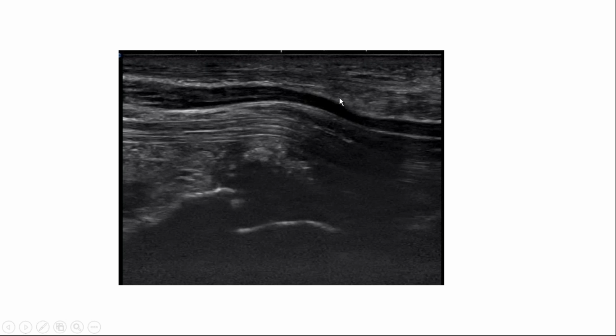Because you're used to looking at these images, it's good to know how normal looks. That's why we practice and spend so much time understanding the normal, so that whenever something looks different, you should be able to investigate a little bit further. Sometimes these are subtle changes which can really help the patient tremendously. Let's say this is your first patient and you're the first contact, you would send them in the right direction. You wouldn't send them to a hand surgeon. You would send them first to someone who would treat this or educate the patient on this.